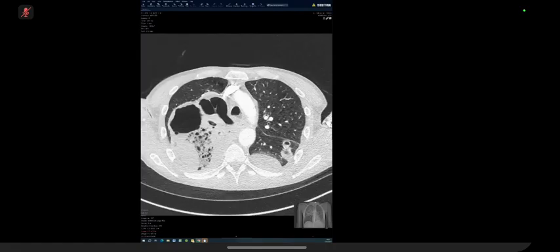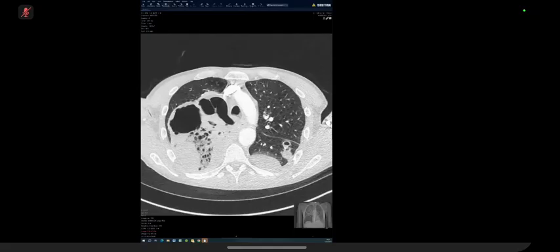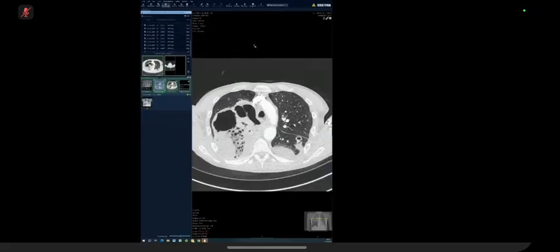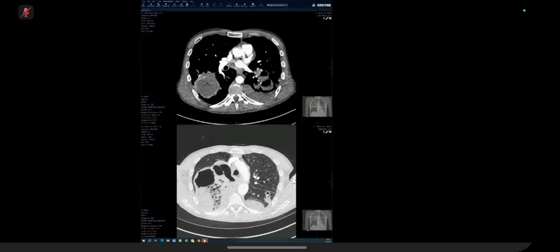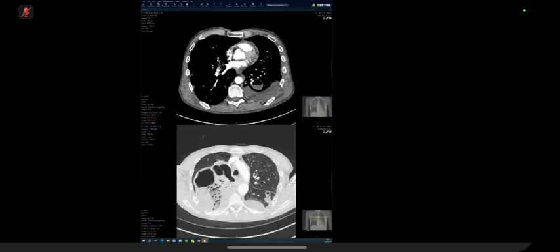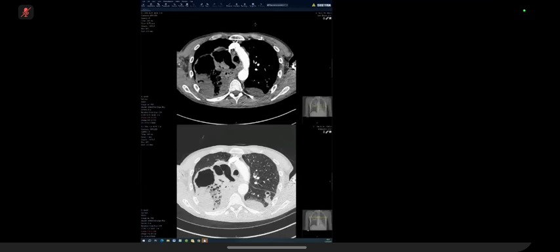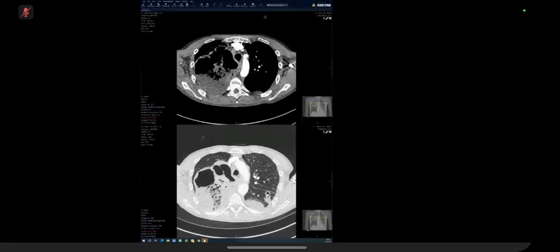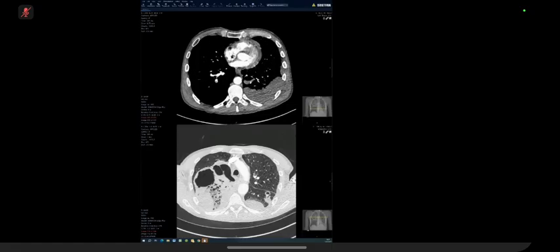Maybe the patient has a history, not typical with TB, not typical, because fluid levels are seen in many other lesions. Okay. Hydatid cyst may be one, but not typical because I can't see the water lily sign in these regions. Maybe necrotizing pneumonia. Anything else in the lung, in the CT?